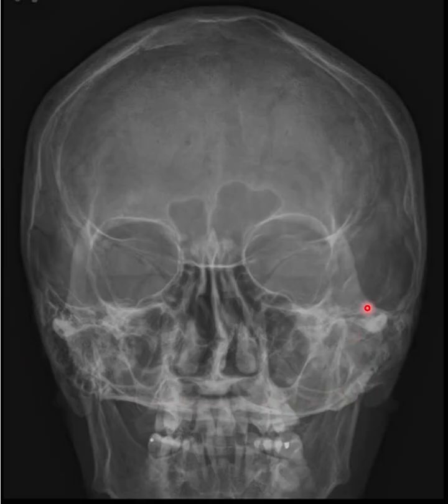And these structures here are the zygoma right here at the lateral borders of the orbits. That's the zygoma there laterally. That's a facial bone, so it's not part of the skull exam, but it is there. But in order to identify that the patient was placed without rotation, we're going to be looking for symmetry of right and left structures. So I would say that the orbits are the easiest to see on the Caldwell skull here. We can see the orbits very clearly.